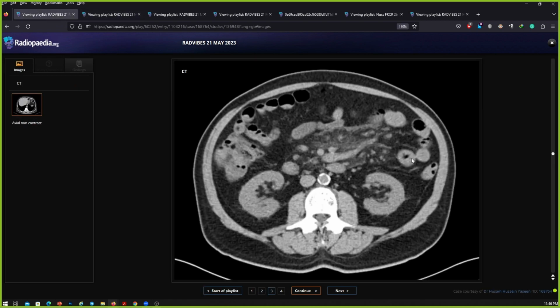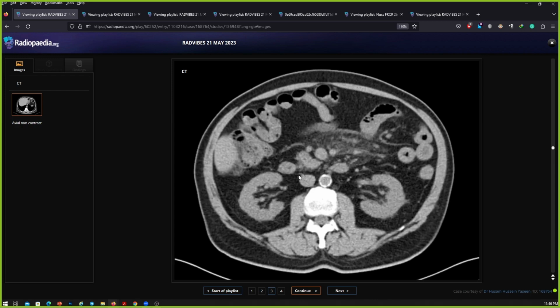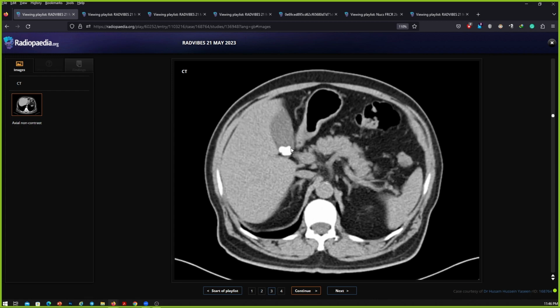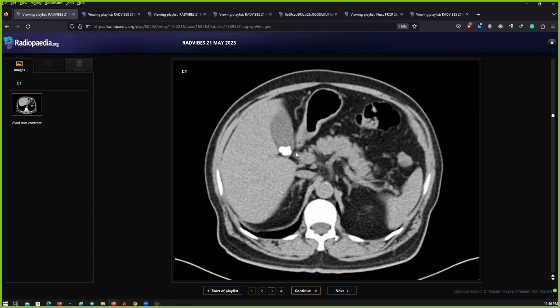This case, mesenteric panniculitis or sclerosing mesenteritis, it has 2 names, I think some more names as well if you go to Radiopaedia, but mesenteric panniculitis is a commonly used term, and this is a self-limiting disorder. Patient usually presents with pain, and sometimes what will happen, just to state that there is a gallbladder calculus as well. I won't say this is just an incidental finding, because sometimes the calculi in these locations, especially in the neck, might impact and cause resultant cholecystitis. So that also has to be treated as a significant finding.